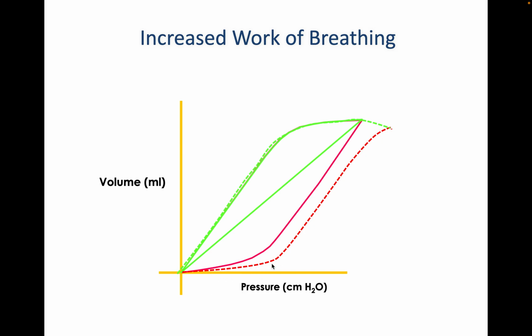So there is increase in the pressure, increase in the effort, and also a little bit of bowing of this, and this happens classically when there is increased work of breathing. So from a distance on a ventilator screen, if you have this kind of appearance where the standard PV loop is slanting forward and a little downward, this is seen in increased work of breathing patients.